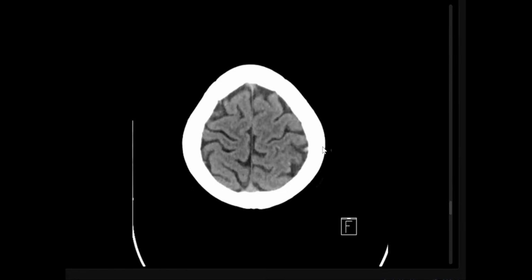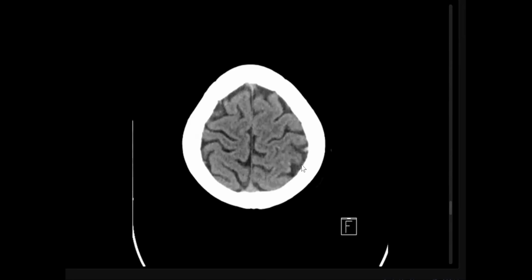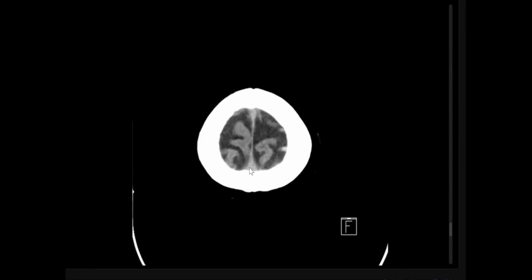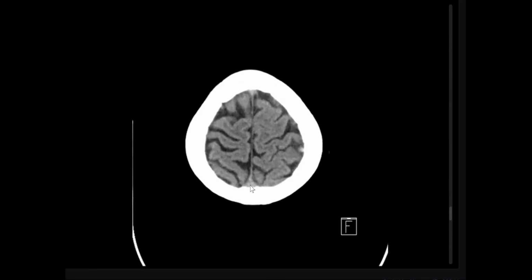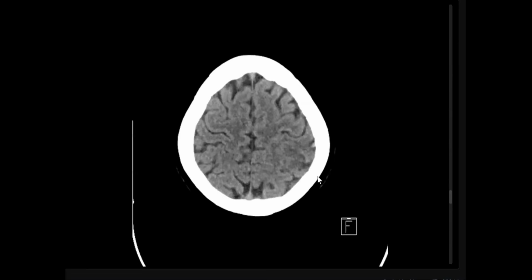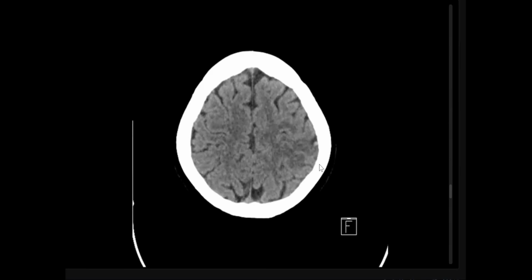The superior sagittal sinus is also hyperdense in the vertex. Mild density, normal size as well. No significant hemorrhage or infarct is seen in the visualized brain parenchyma. So I will do CTV or MRV of this patient for further evaluation of all the venous sinuses and veins, deep and superficial. Good.